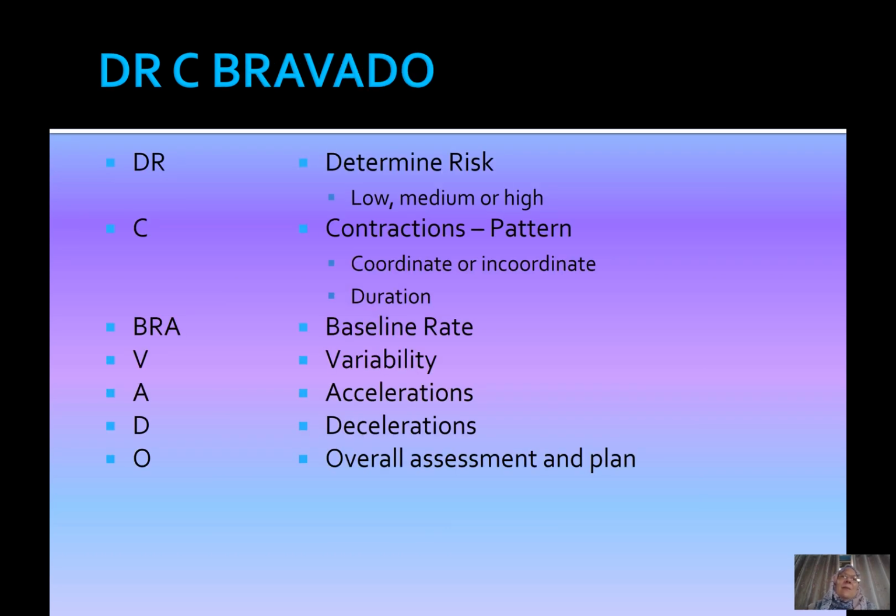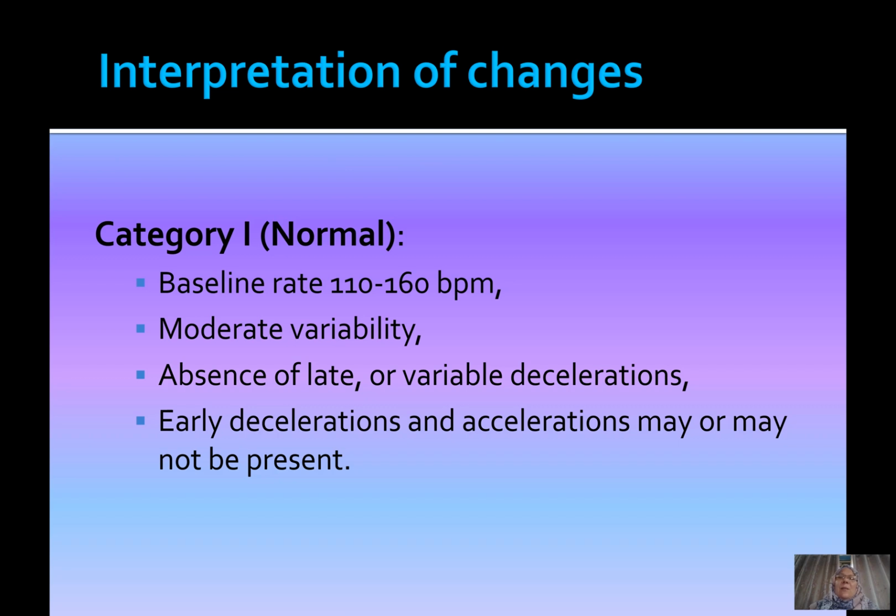Just coming back and reminding you of this abbreviation, Dr. C. Bravado, so that you can always look at CTGs systematically and not miss any of the parameters. Interpretation of CTGs can be tricky, especially in the routine of a labor ward where it's very busy and you might feel pressurized to do things. Therefore, it is a good idea to categorize CTGs so you know what you're dealing with.